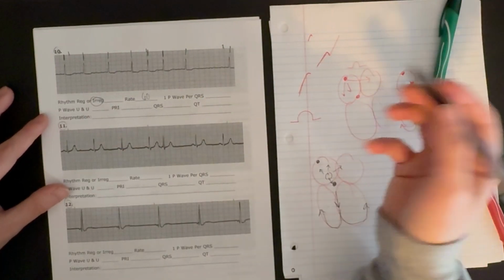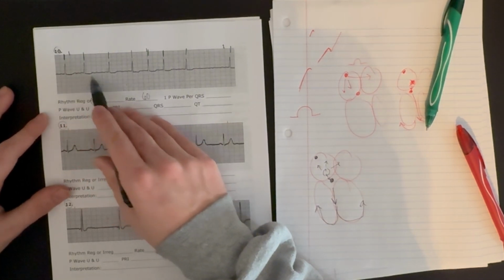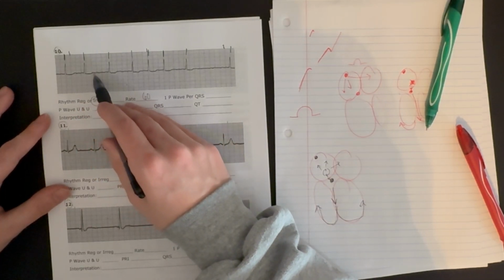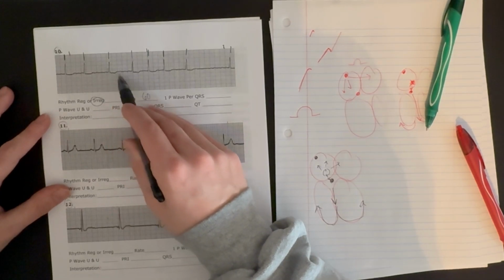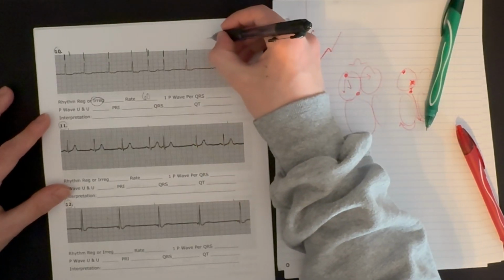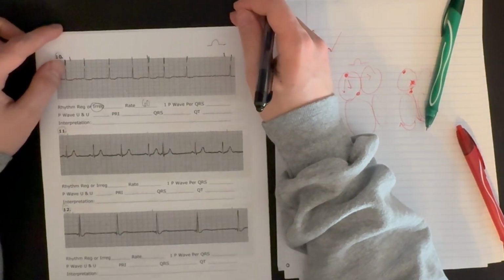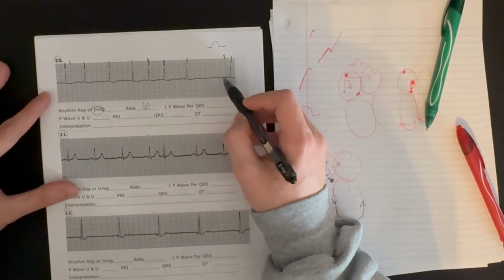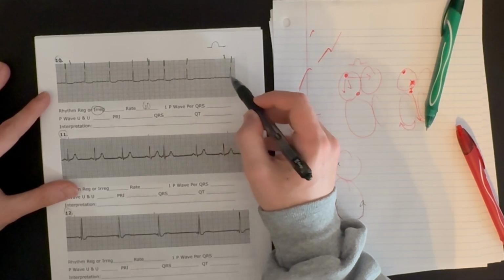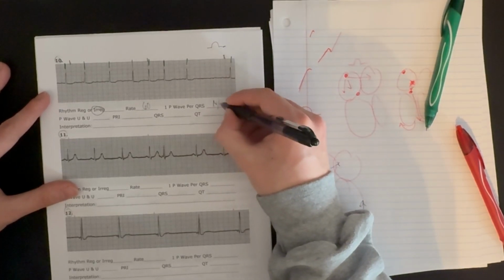Okay. Do we have one P wave for every QRS complex? Well, let's see. We don't see any distinct P waves here. We do see activity, these small little oscillations up from the isoelectric line, but none of them is a coordinated depolarization of the atria, which is what a P wave should look like. Instead, we have a little bit of activity in the atria between each QRS complex. So we can't measure this, and we're going to say NA.